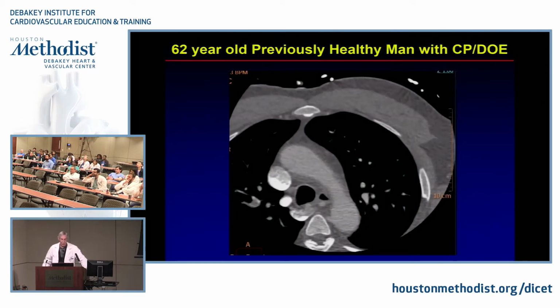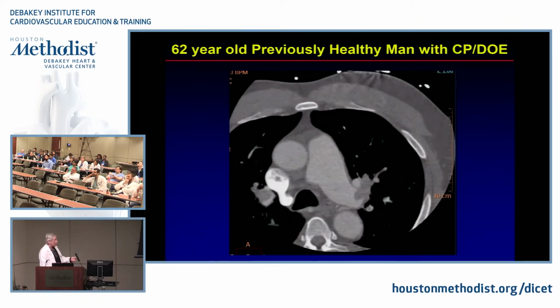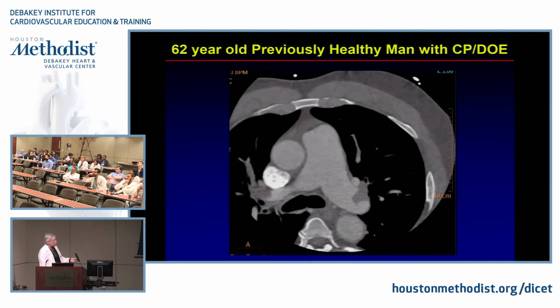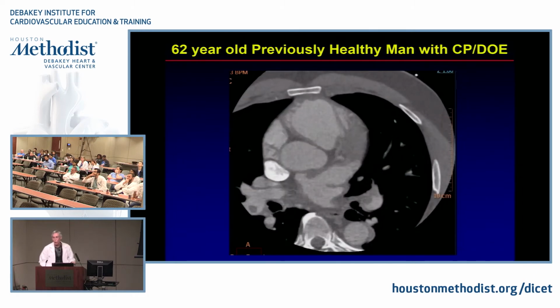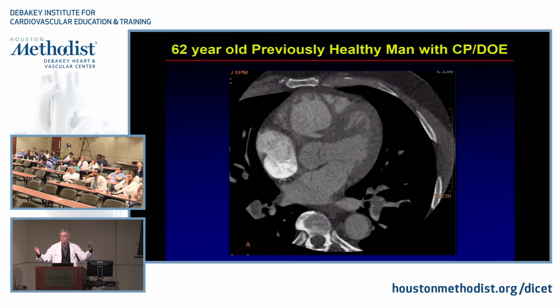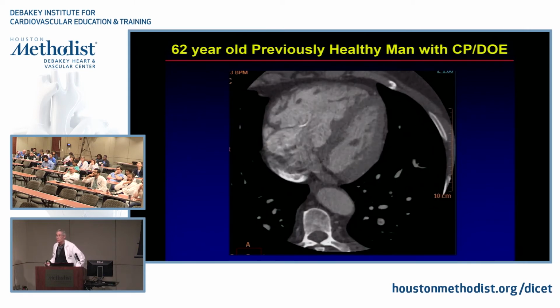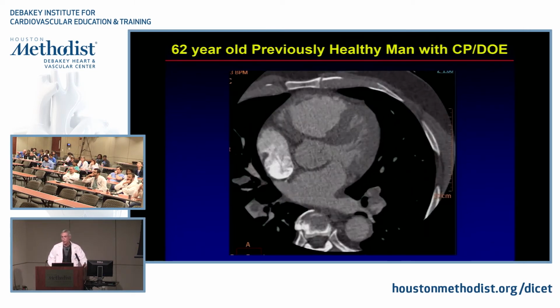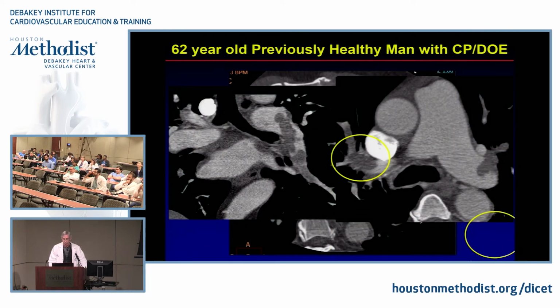So then we can look at this instead. This is now looking at the axial data. The pulmonary artery you see is dilated, right? And what else do you see? You see these big clots. All right, so the guy had multiple large pulmonary emboli. And again, a tip-off on the nuclear study was, like we said, when you do the CTs, anytime you see a dilated pulmonary artery, you should immediately look for pulmonary emboli, right? And in fact, there they are. There's a big one there, and multiple. I mean, the guy had multiple pulmonary emboli, okay?